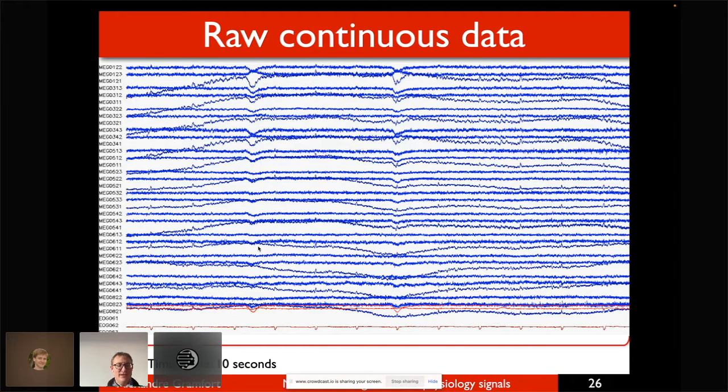Also looking at Discord. Okay, yeah, so we have some people saying blinks, eye blinks. Yes. So the blinks are typically here. Okay, so this is one source of so-called physiological artifacts. There are other artifacts that you see. Typically, you will see them in the dark blue channel, so in the magnetometers. Any more activity on Discord?